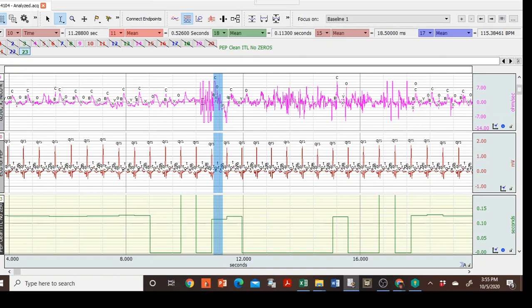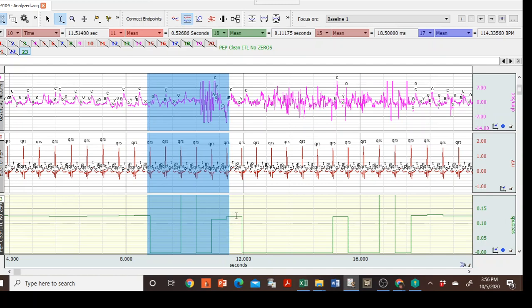It's still part of this where the rhythmicity drops off and an impossible noisy squiggle kicks in. That's noise, so this is a noisy value, and we're not so happy with it. So we're going to take a connect endpoints between this value and all the way over to this value, which looks like it kicked in and started gathering real data. That looks like a nice clean cycle.